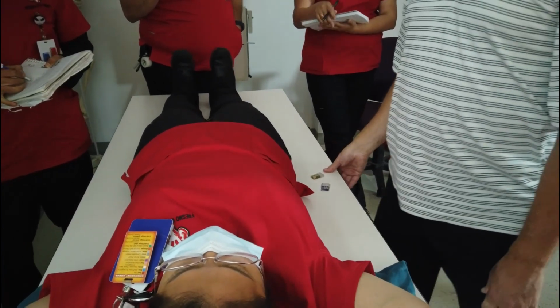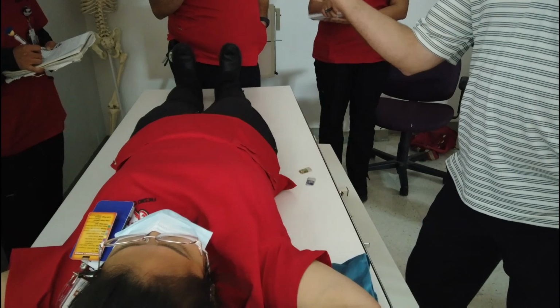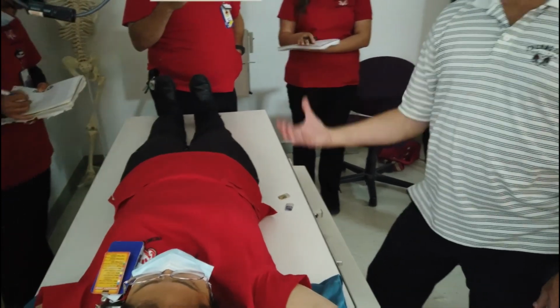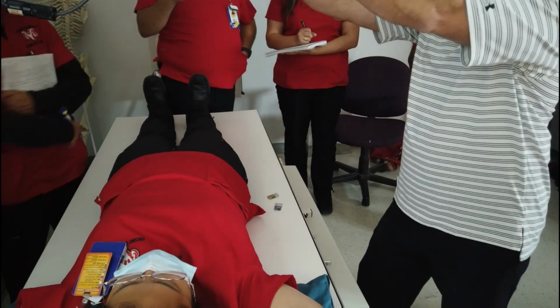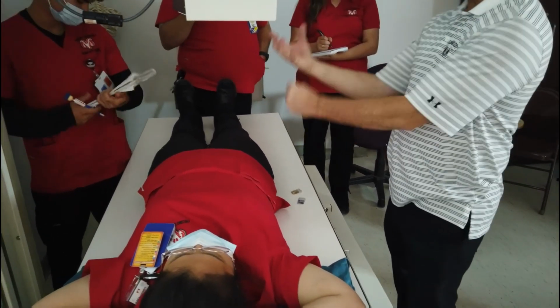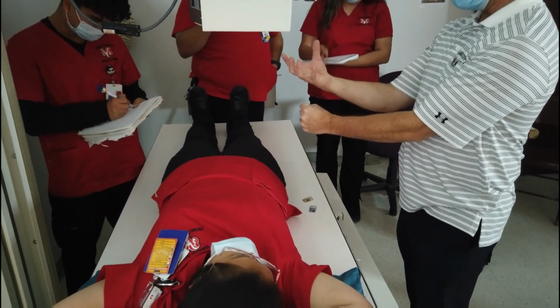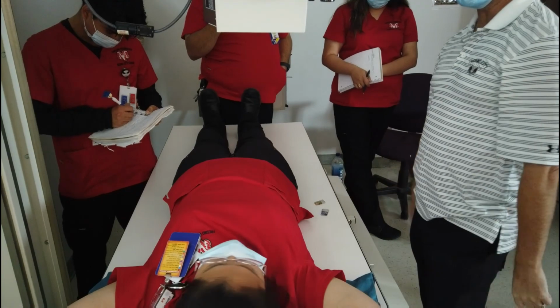Okay, so then we're going to go to the next page, the cystogram. Most of the bladder lies posterior, behind the symphysis pubis. So we're going to angle 10 degrees. That will take the symphysis pubis and throw it below the bladder, out of the way.